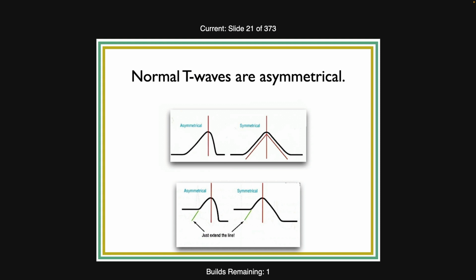I know that I've been looking for a long time, and sometimes I'll sort of test myself and I'll say symmetrical, asymmetrical, and the way to really find out is to sit there and use a ruler, and I'm wrong a bunch of times. And I've noticed with people who are just learning, such as yourselves, that they'll say, oh, that's symmetrical or asymmetrical, and I look at it and say, that's not. So you should know this, but it's less useful than you think, just because it's hard to see.